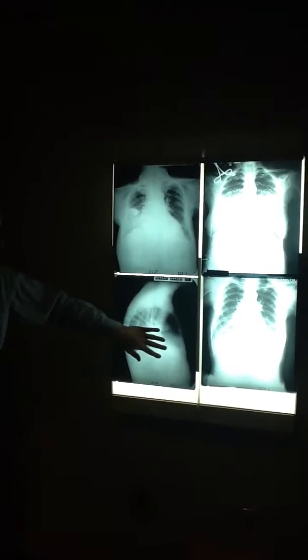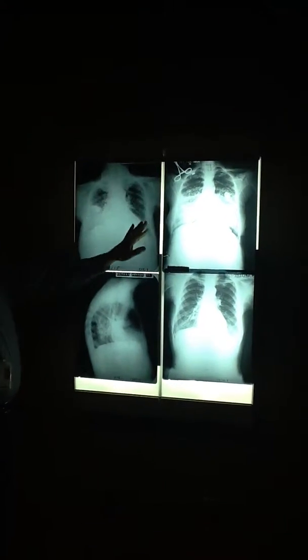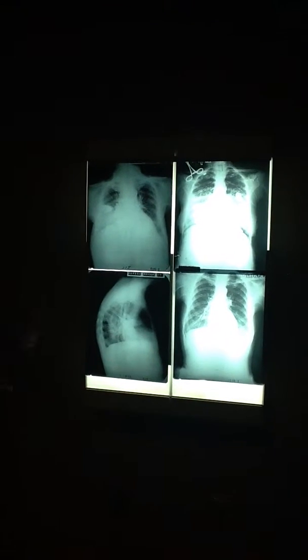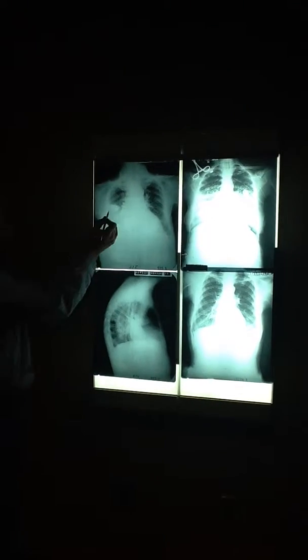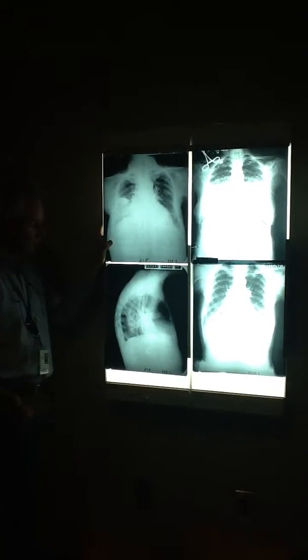And in congestive heart failure, you know, they start getting pleural effusion, and it also slows down their lymph absorption, and they start getting a pleural effusion. Why it happens between the fissures, though, is a mystery. But this looks like a mass, doesn't it? Looks like a mass.